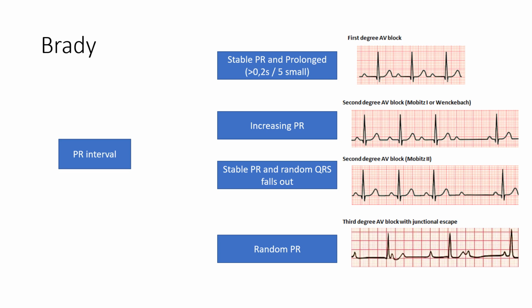So they move at their own pace, and the QRS is a junctional rhythm. But if you only look at the PR segment, you see a long PR segment, then you see a T wave, then a narrower PR segment, and then small. So in a small strip, sometimes it can add up to look like a Wenckebach or Mobitz type 2, but usually if you get a longer rhythm strip, you can see it.